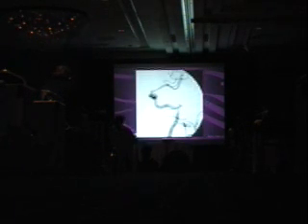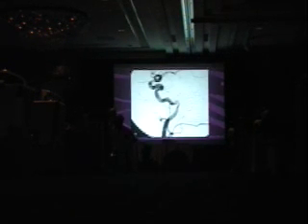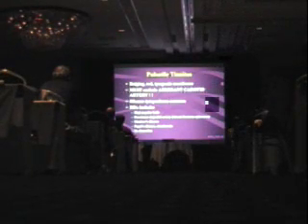But the one thing, again, you want to watch out for is an aberrant carotid artery. Normally the petrous carotid canal ends here. If it sits up against the tympanic membrane and you try to take it out or biopsy it, you're going to have an arterial bleeder and cause a stroke and a dissection. And again, another case that was sent to us, glomus tympanicum. Normally this is a smooth border on AP or lateral, and if there's a little nipple that comes out along the corner of the carotid artery, aberrant carotid artery, never, never, never miss that. If you see a bulging red tympanic membrane, something in that location.